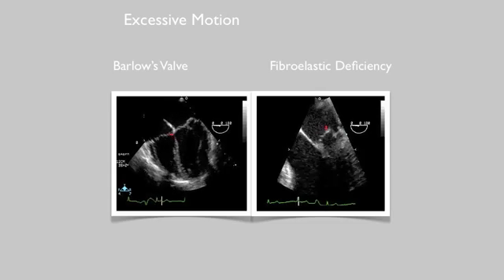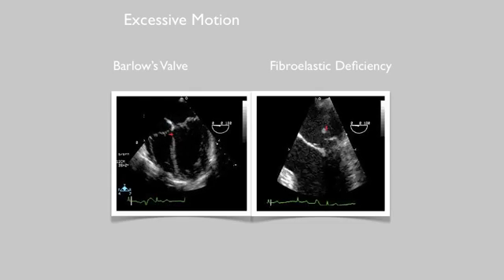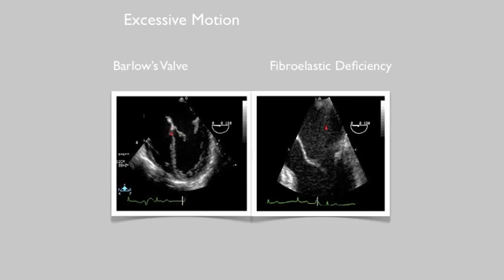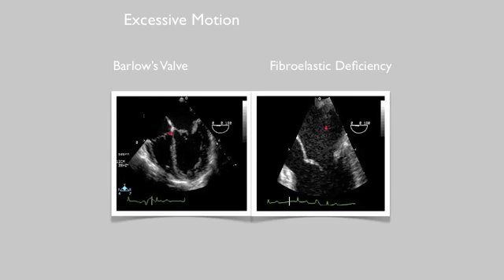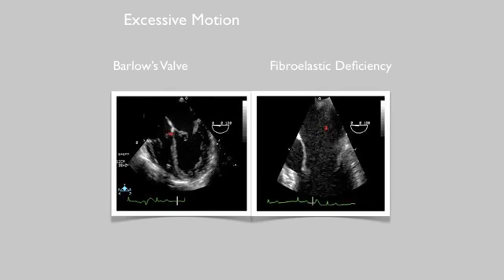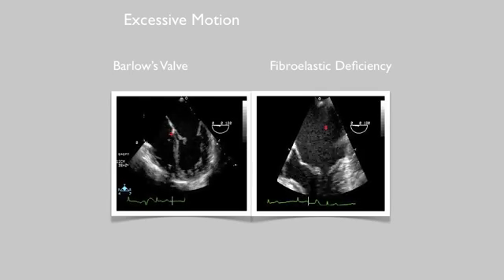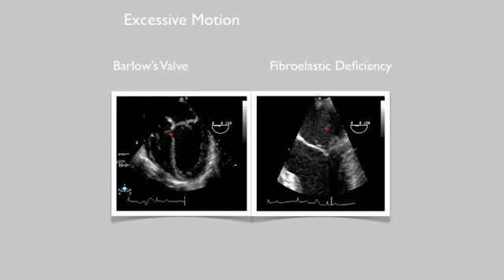Note that the tip of the posterior leaflet extends above the annular plane, making this a flail as opposed to prolapse. A torn chord can also be seen attached to the flail leaflet at end systole. The regurgitant jet would flow away from the leaflet prolapse.